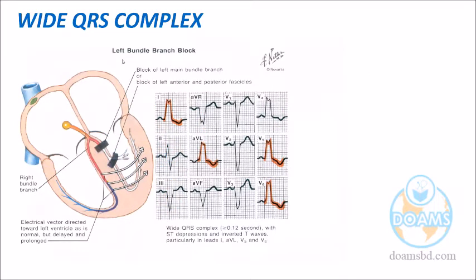If you come here to see the left bundle branch block, the same thing will happen. You see, in V5, V6, this is M. In V1, we expect that it would be W, but it does not happen. Lead 1 is a left-sided lead. aVL is a left-sided lead. V5 and V6 are left-sided leads. To make it simple, my junior colleagues, you minimum look at the chest leads from V1 up to V6, then you will be able to identify. You may forget lead 1 and aVL, but we have to remember the lateral MI and the aVL lead territory. We must remember. So left-sided wider.